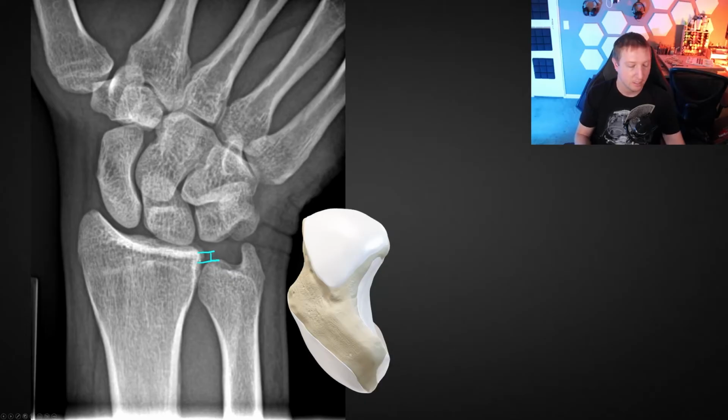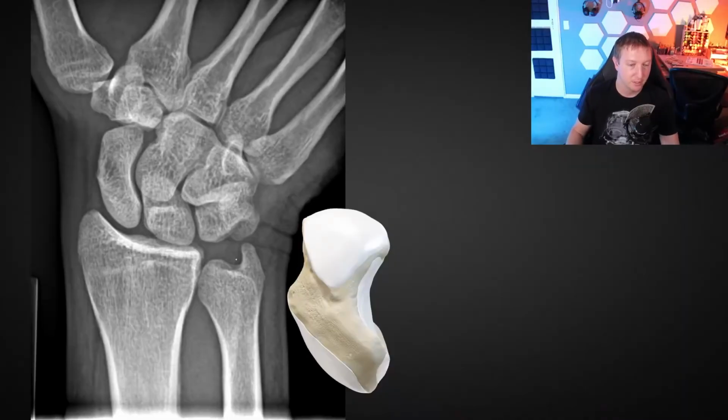For example, when we take a wrist x-ray, oftentimes it's on a table, some distance below the shoulder. But to get true neutral ulnar variance, we would need to take the x-ray at shoulder level, and usually we don't do that. And so, when you put your arm down like that, it does apply a little bit of proximal tension on the ulna, which will cause up to 2 millimeters of physiologic radiographic shortening. So I drew that here. You couldn't see it. So proximal tension on the ulna. All right. So this one probably is under 2 millimeters. It looks like it's kind of on the fence, maybe a millimeter or so of negative ulnar variance.